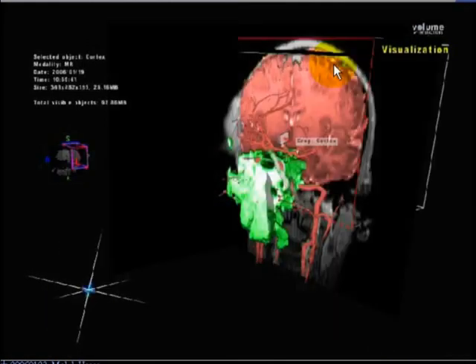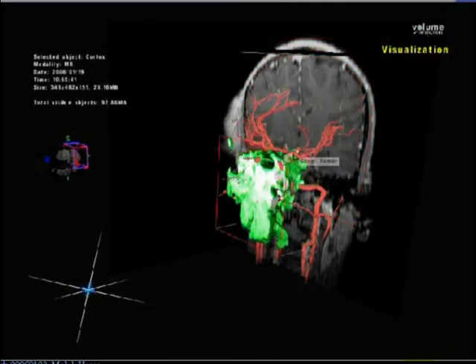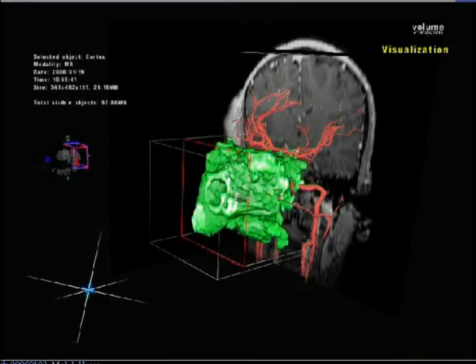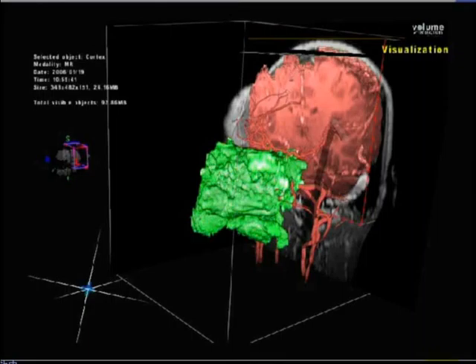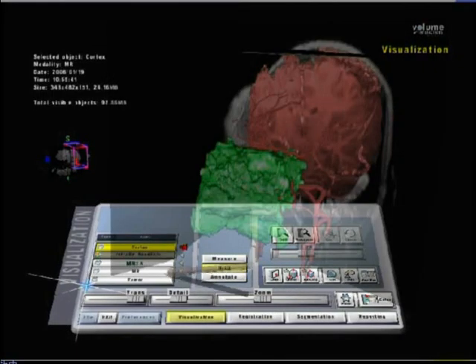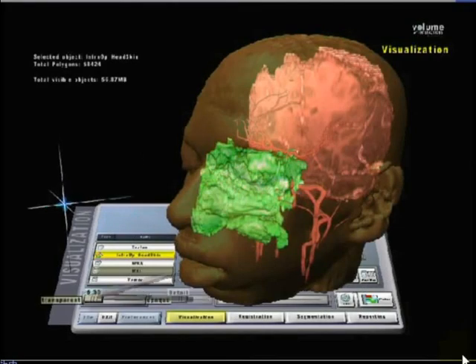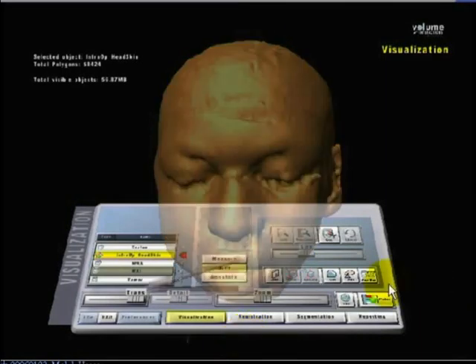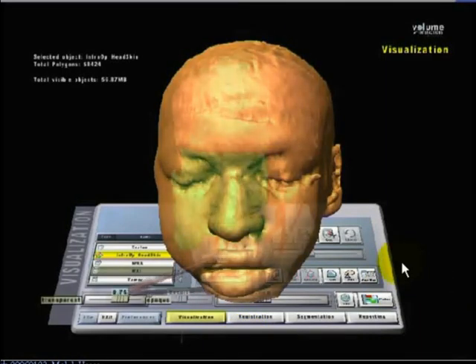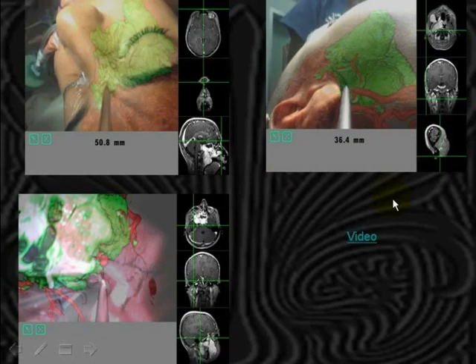And of course we can put in the brain now and consider finally the whole 3D image. You can see a final image of the patient. You can see that there's a vast maxillary prominence here, and you can even generate a whole image of the face and all its bits in the cranial cavity. So we use our navigation system, so you're able to pinpoint all these lesions.